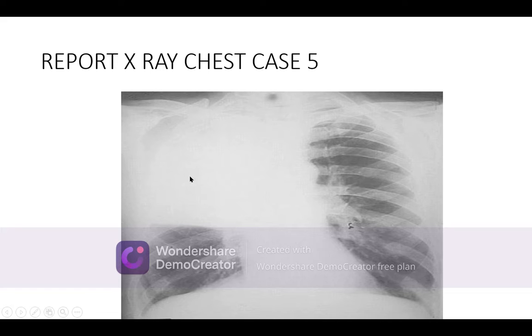But according to the clinical features and data actually given to you, it is acute inflammation of the lung involving the parenchyma very extensively. It is consolidation, and there are 4 stages of consolidation. This is the stage of red hepatization because no air bronchogram pattern is seen. So it is stage number 2 of lobar consolidation. It is very clear, and I have justified it. Other causes are possible, but because of the clinical data available, it is very near to acute inflammation, rather than chronic inflammation, tumor, or other miscellaneous conditions which can cause opacity.